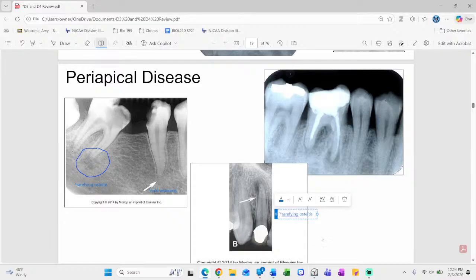And here I've got picture number 30, endo treated, and yep, rarefying, and maybe even I'm going to call that sclerosing. It looks like it's been there a while, and the bone's gotten a little harder around that mesial root here. All that bone is thickened and hardened here. We're also up into the furcation here. Bone levels are okay.